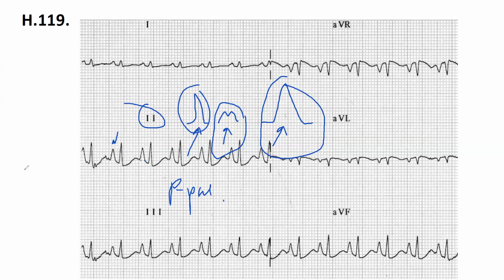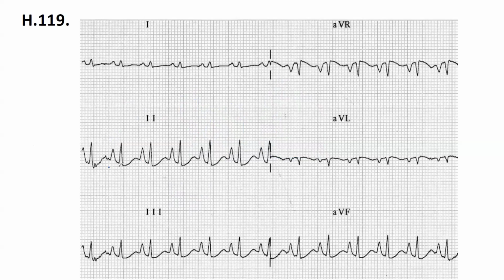Next, PR interval. I think it's fine, it's normal. Good, very good. PR is normal. All right, QRS. It's narrow. Good.